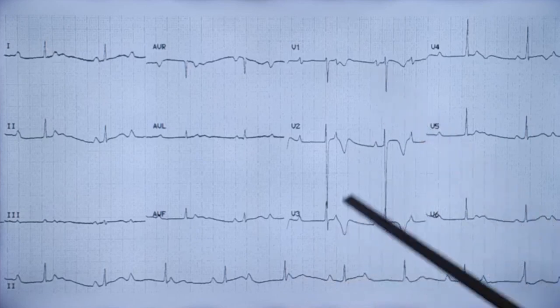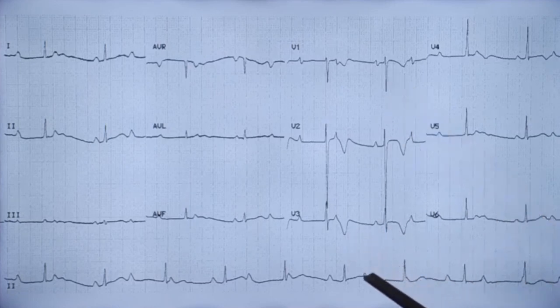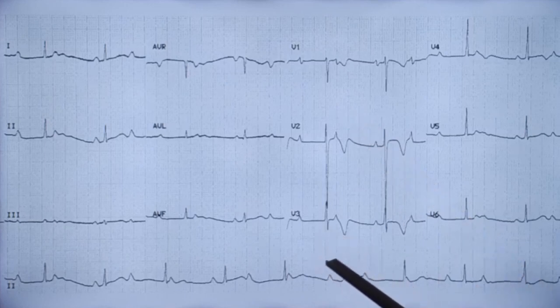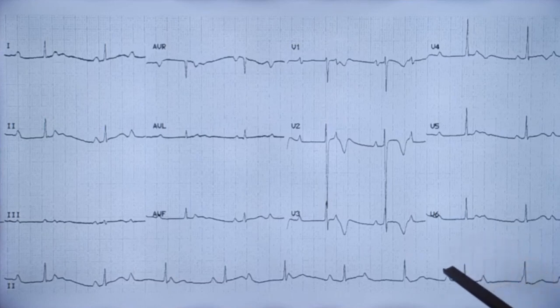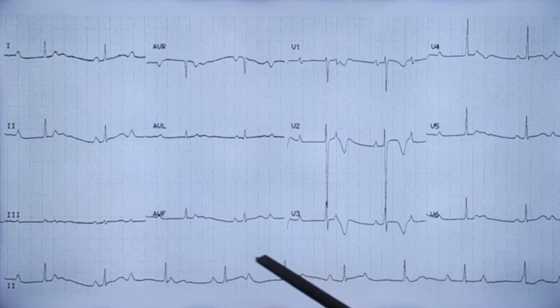T inversion, being a narrow T inversion, could be a juvenile T inversion, and with a better heart rate and a narrow QRS, supra Hisian complete heart block. If this is in a child or a young adult, you will think that this is juvenile T inversion and the heart block is congenital complete heart block, in which usually the heart rate is better as it is supra Hisian and narrow QRS, as the AV junction, the lower part of the AV junction, will be controlling the ventricles.